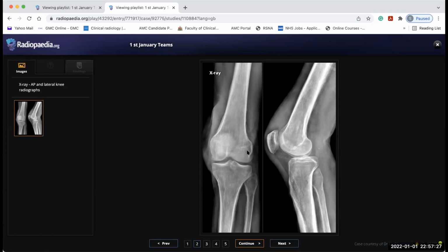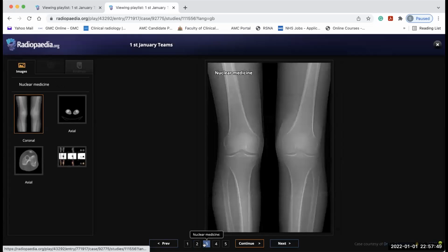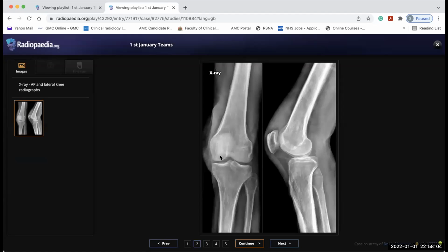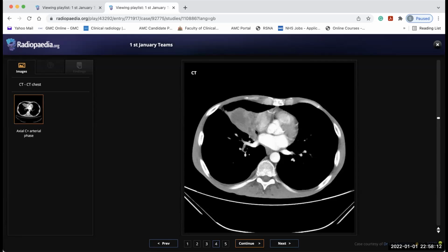Pulmonary causes like bronchiectasis, pulmonary pleural fibroma, or bronchogenic carcinoma, and also it can be associated with renal failure. Okay, so this patient, we did the nuclear scan and a CT first, by the way, and we found this lesion in the condyle. If you go back to the X-ray, you find this small osteolytic lesion here as well. After this the patient went for a CT scan of the chest, where we found this middle lobe mass with consolidation.